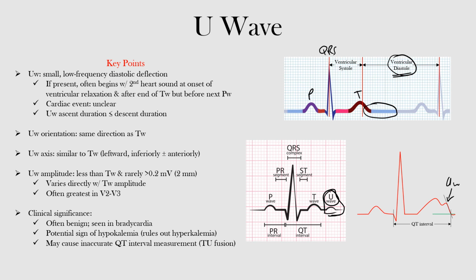Remember when we talked about T waves, they had that asymmetric appearance. Imagine this is our peak here. Notice there's asymmetry, and each side is different from the other, with the slow ascent going up and more of a rapid downfall, okay? And with these U waves, you tend to have almost the opposite, or it could be equal as well, all right?